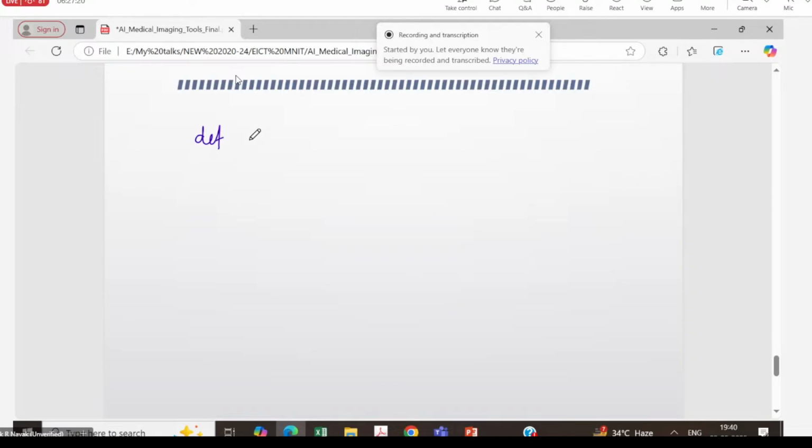Let's say I have a function here known as the GLCM function, which takes the input and ultimately returns 5 features, through the return statement within the function. And we have to define what F1 means, what F2 means, what F3 means. It is nothing but applying entropy over the NGLCM matrix. Nothing else. It's very simple to understand, because we are simply using functions here.